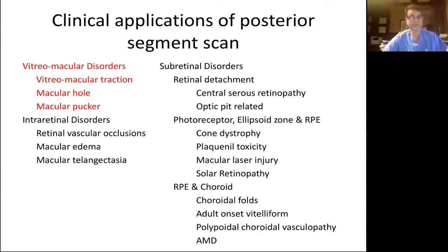Next, I'm going to review some of the clinical applications of the posterior segment scan. We're going to start on the retinal inner surface and work our way posteriorly to the RPE and choroid. So first we'll cover vitreomacular disorders.